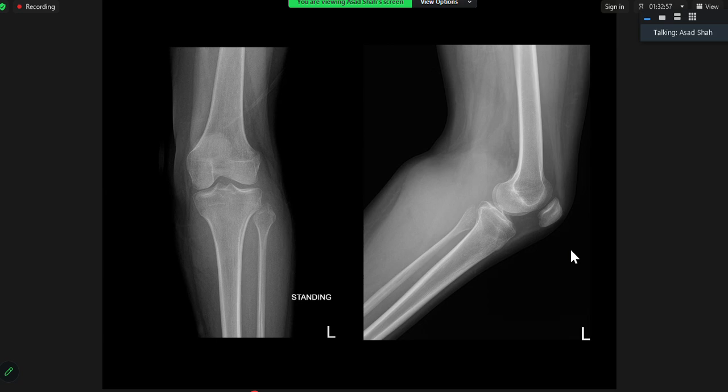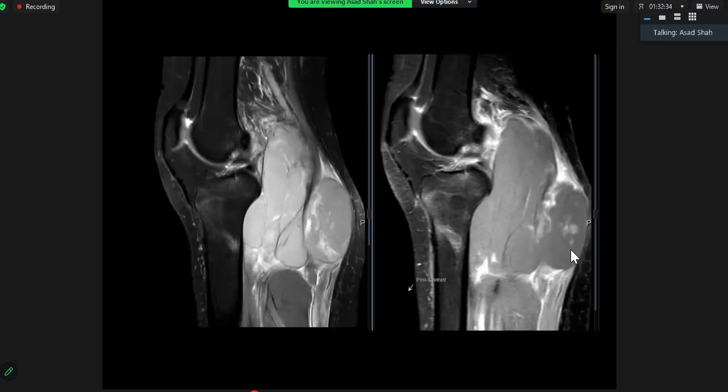Said calcification. What does that imply? If you see calcification in a soft tissue mass, it could be myositis or some calcified hematoma. If there's a bone tumor, then they could represent chondrosarcoma, with ring and arc calcifications. Okay?